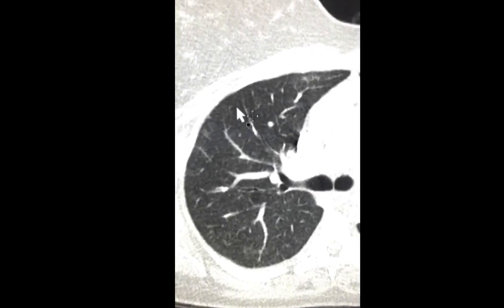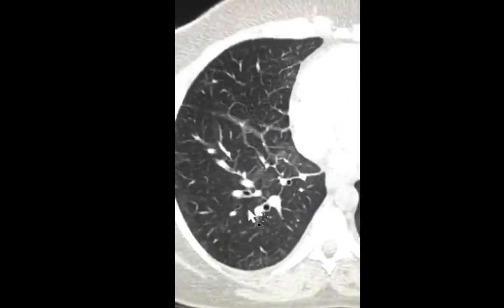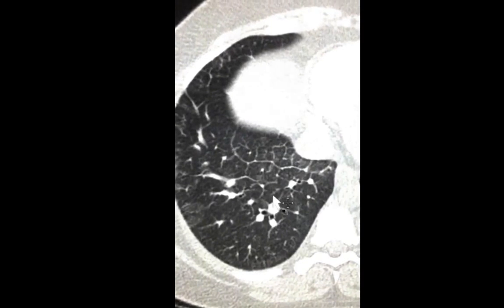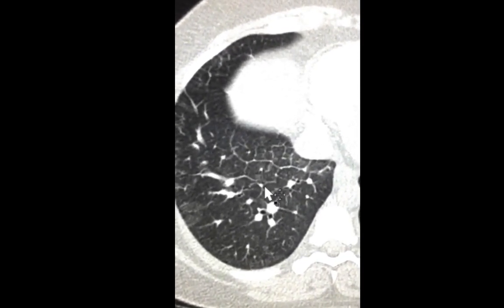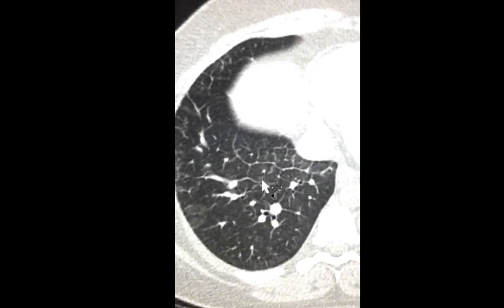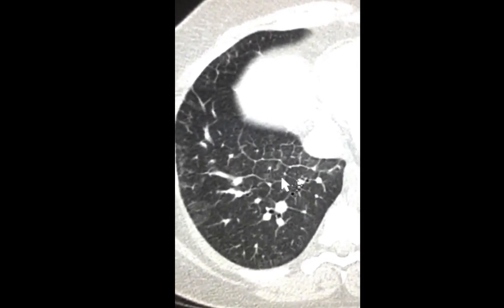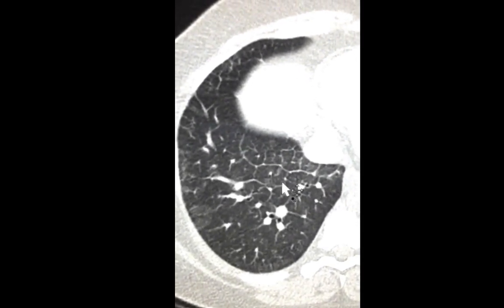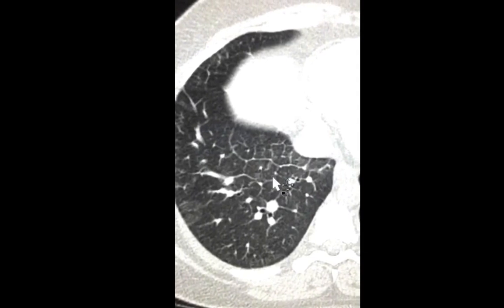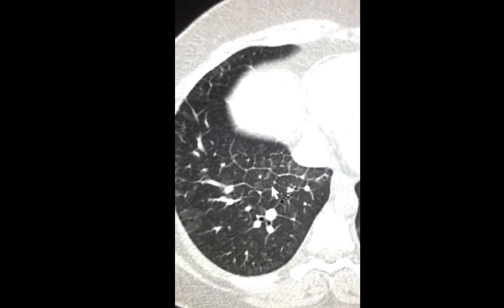To summarize, part of the backbone of the lung are these connective tissue septations. Septations within the lung are usually not seen or seen with difficulty. If they are clearly thickened, that's abnormal. Divide the thickening into smooth, nodular, or irregular septal thickening. The smallest building unit of the lung is called a pulmonary lobule. If you have smooth septal thickening, it could be acute or chronic. If it's acute, think about edema, hemorrhage, atypical pneumonia, and eosinophilic pneumonia. When this appearance is chronic, there are many causes. The most important would be lymphangitic carcinomatosis.